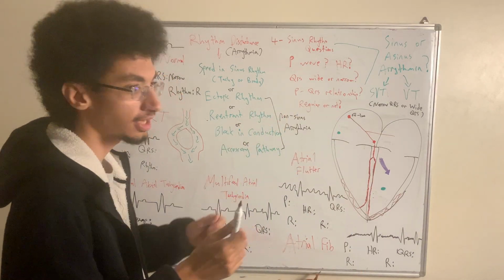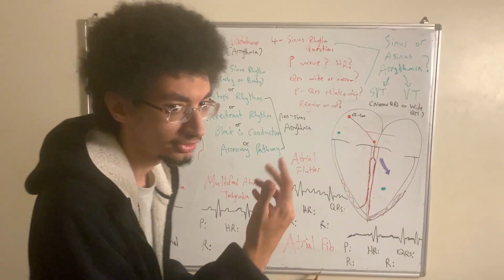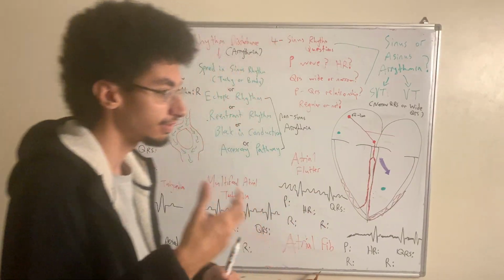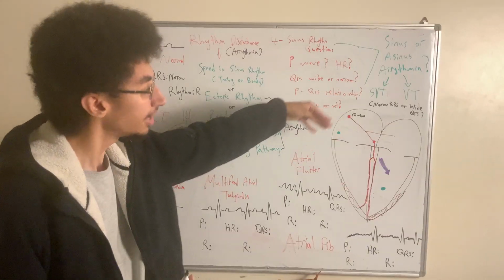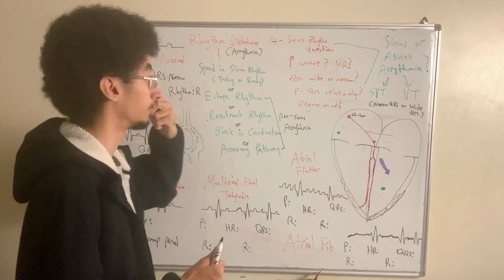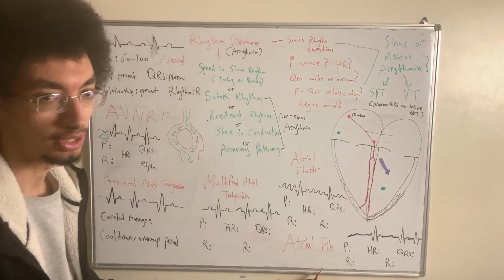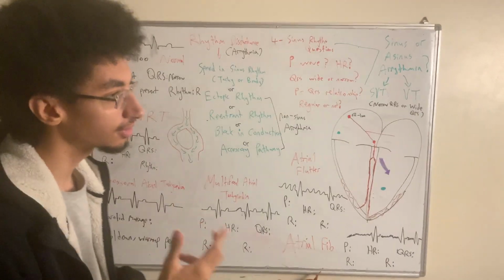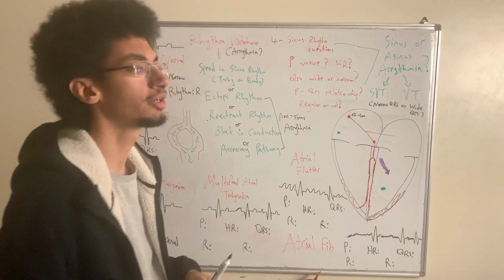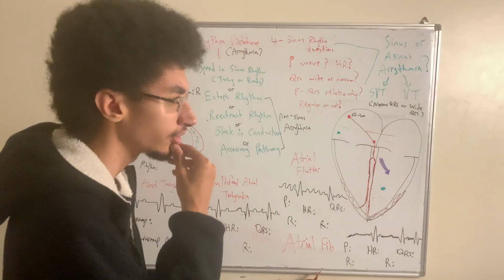Now, this is sinus arrhythmia. Now we come to the other part, which is non-sinus arrhythmia. You have an arrhythmia arising from a place that's not coming from the SA node, anywhere besides the SA node. And regarding non-sinus arrhythmia, we want to ask ourselves a question. If it's not coming from the SA node, it's not sinus in origin.